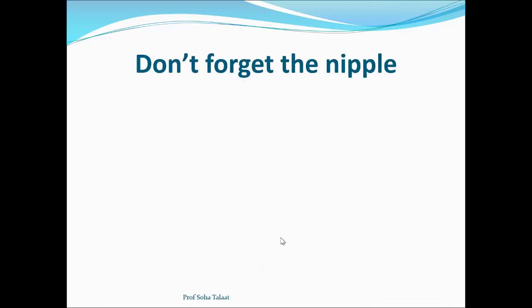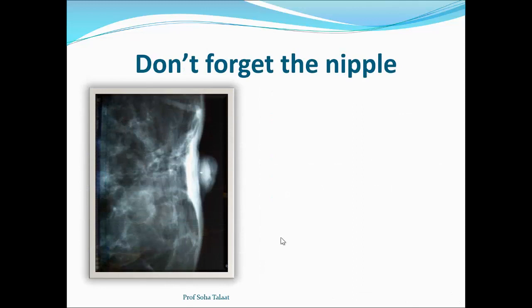Don't forget to look at the nipple. The nipple is very important. You must localize on the nipple. If you find the nipple is enlarged, you must look at it well.